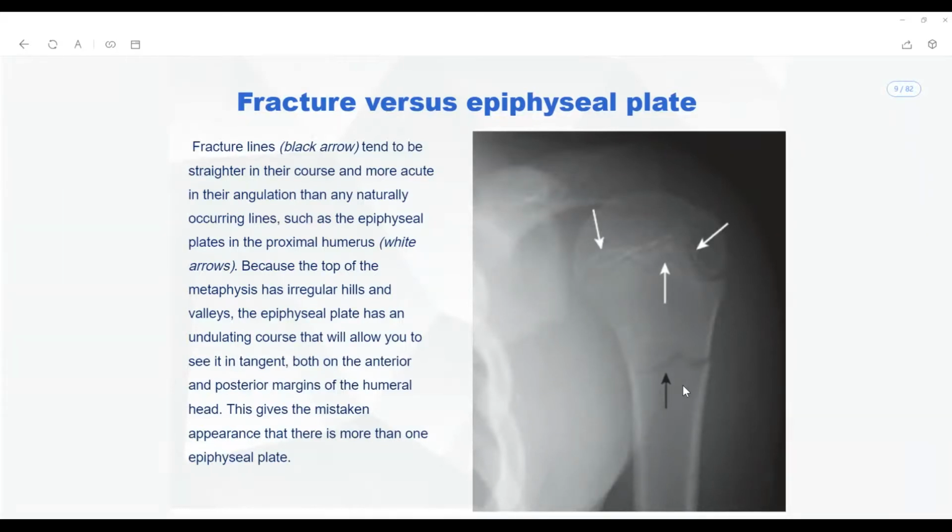Why does Debelina think it's an incomplete fracture? Oh, sorry, why does Debelina think it's a complete fracture? Because the other cortex is completely intact. Or is it an incomplete fracture? All the people who have been saying it is an incomplete fracture, you are not looking closely. You are forgetting the rules of observation. What is the rule of observation?